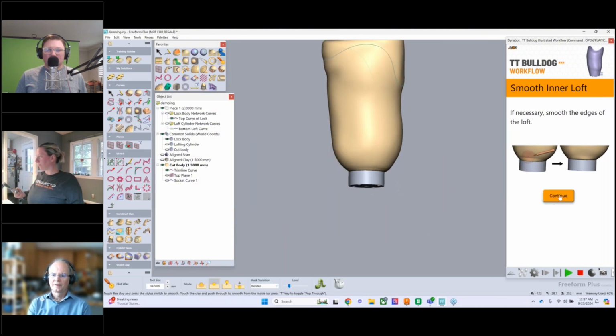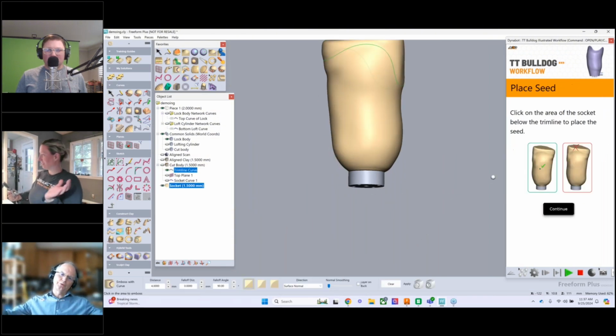Okay. So all you did was position the plane, and then the script automatically took over and did the intersection between the plane and the model to give you that curve to blend it to. Yep. And showed up a different curve from a solid body. Yes, all of that was on the back end.